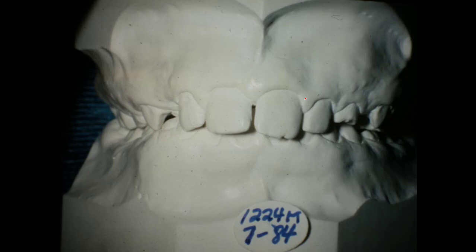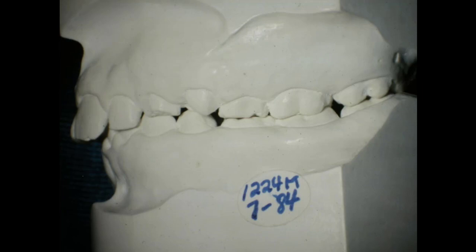They've got several things wrong with them, not a whole big bunch of problems, but the bite's too close on it, and I think he has a slight class 2 problem, but not a severe one, with a little overjet. Of course, the overbite in here, and we're going to try to bring the mandible forward and get the class 1 correction, and we'll have to enlarge the arches. Now they'll be kind of deformed with that tooth being in the palate like that.